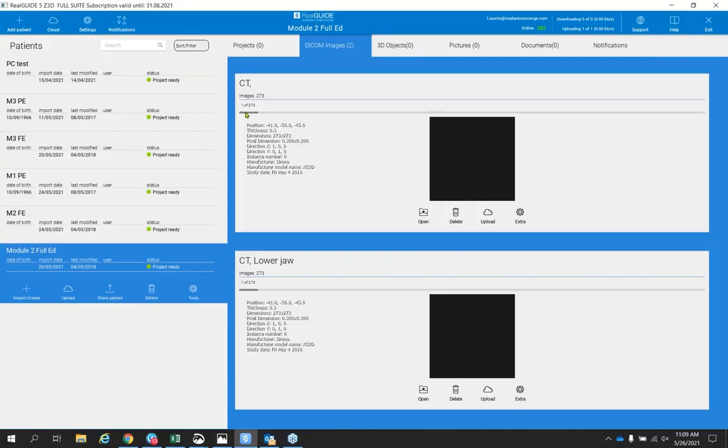Now, what's nice is you can quickly grab this scroll bar and just scroll through and make sure that the files have loaded completely. And this is our patient scan. Remember, we're going up from the inferior border of the mandible through, and you can see those two little dots. Those are our fiduciary markers captured with the denture in place intraorally. And there's some others, all right? And then as we go up, now this case had a maxillary denture, which we're not going to register today, but you can see that as well, right? So we know that our patient scan is good.